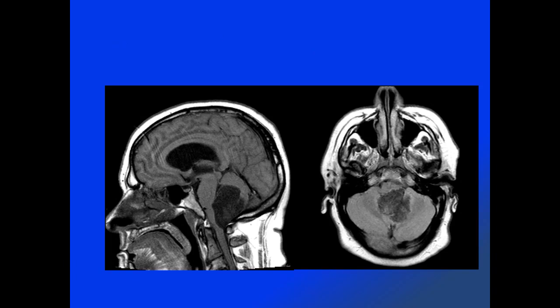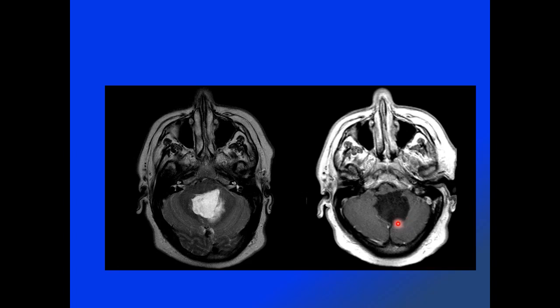In a different patient, we see a hypointense mass on T1 weighted image, which is slightly higher signal intensity than that of CSF within the fourth ventricle with extension caudally through foramen magnum with deformity of the posterior aspect of the medulla and upper cervical spinal cord. The axial image demonstrates a slightly heterogeneous internal signal within this mass. T2-weighted image demonstrates prominent hyperintensity, and a post-contrast T1 weighted image demonstrates no appreciable enhancement.